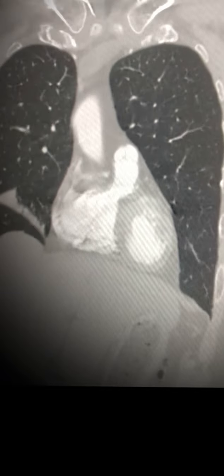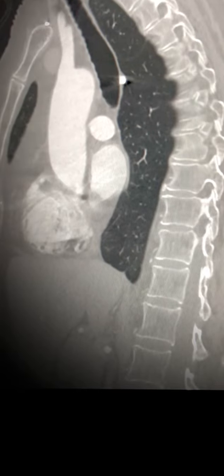We're going to look at the coronal image, where the orientation of collapse is better demonstrated in this orientation here, but this doesn't always happen to be the case, and it depends on the orientation of the other lobes. In sagittal imaging, it becomes much clearer, and in this particular case, the middle lobe has collapsed downwards and is like a flat band occupying this portion.